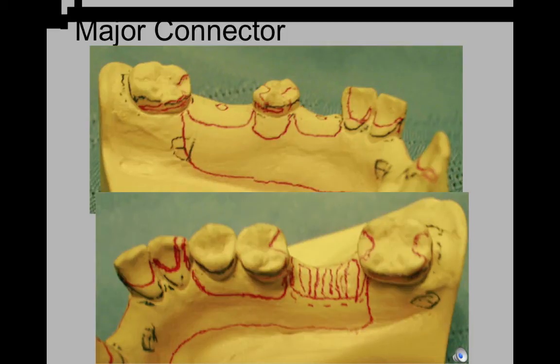The superior border of the major connector never will be resting on the gingiva at the cervical part of the tooth. It is usually on the tooth as plating in the middle third, or you drop down behind the tooth and avoid the marginal gingiva by 3 or 4 millimeters on the mandible and 5 or 6 on the maxilla. The solid part of the metal of the major connector between the superior and inferior border of the mandible major connector must be a minimum of 4 to 5 millimeters. It can be wider, but it has to be a minimum of 4 to 5 millimeters.